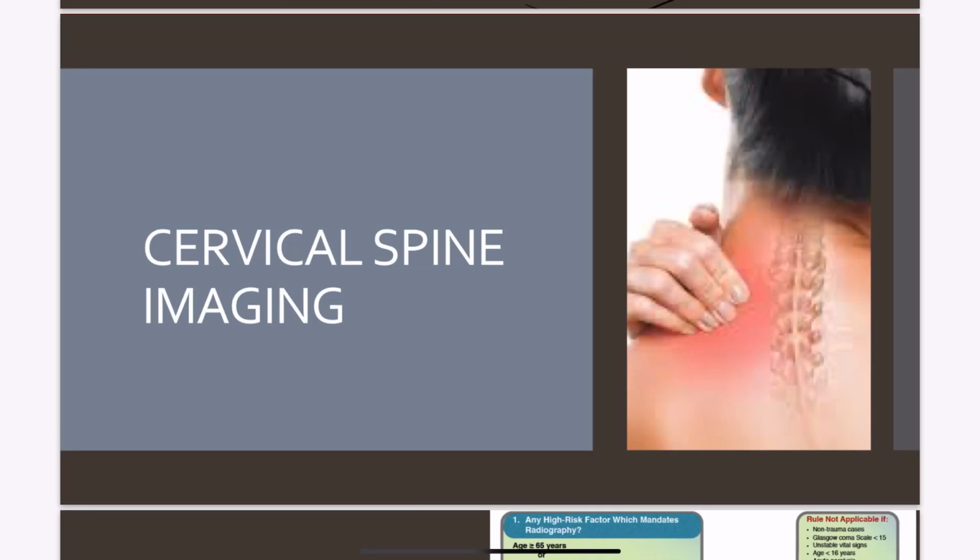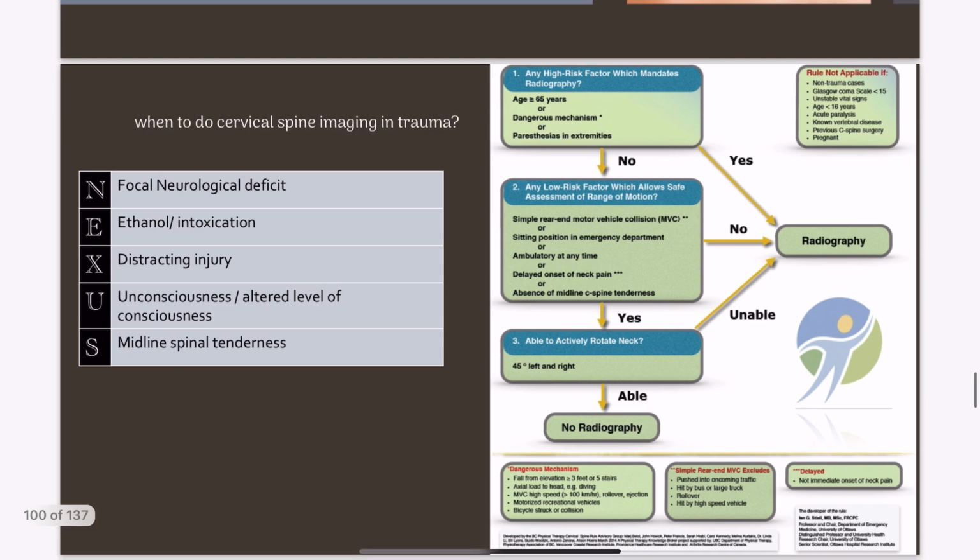Today our topic of discussion is cervical spine imaging. Specifically, cervical spine imaging, per se, is pattern identification. We have to identify the pattern and compare it with the given X-ray. So what is the indication to do a cervical spine imaging in trauma?